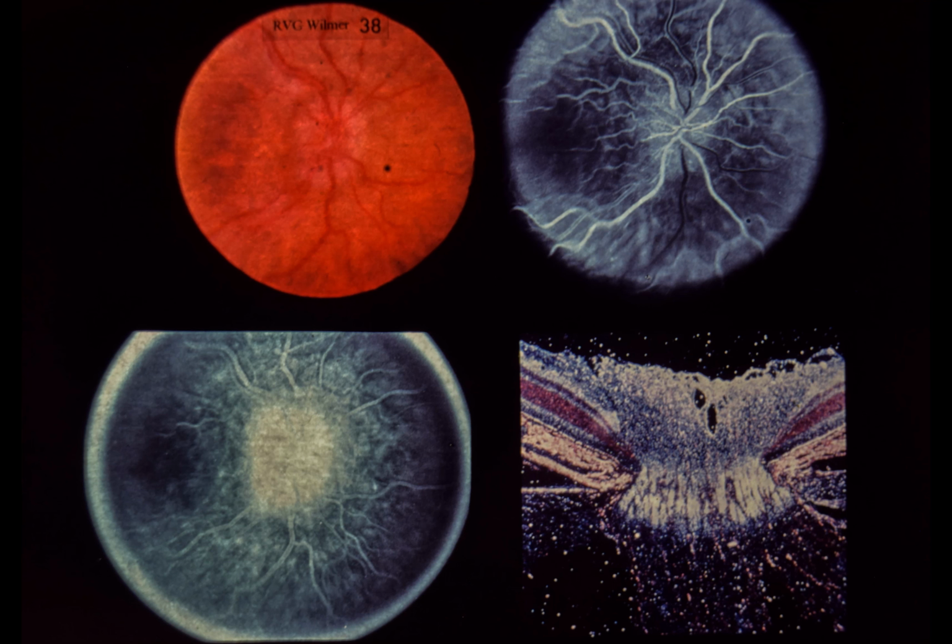Upper right. A fluorescein angiogram shows dilated optic disc capillaries. Lower left, a late-phase fluorescein angiogram shows extensive leakage from the right disc. The cyclodialysis cleft was closed by penetrating diathermy. The intraocular pressure returned to normal, and the optic disc edema cleared. Optic disc edema from hypotony may occur after intraocular surgery or trauma. The diagnosis is generally obvious from the history and the finding of low intraocular pressure.